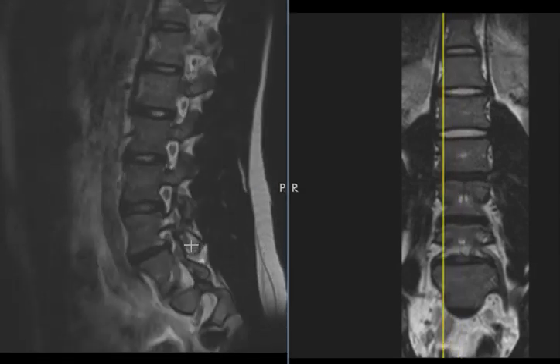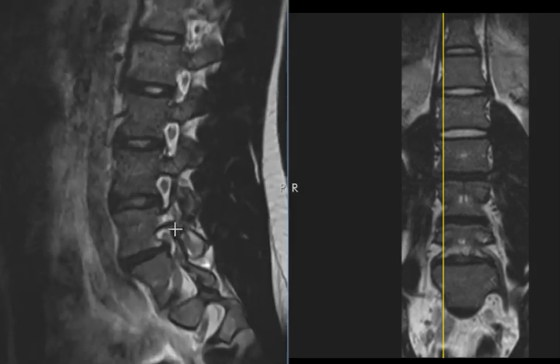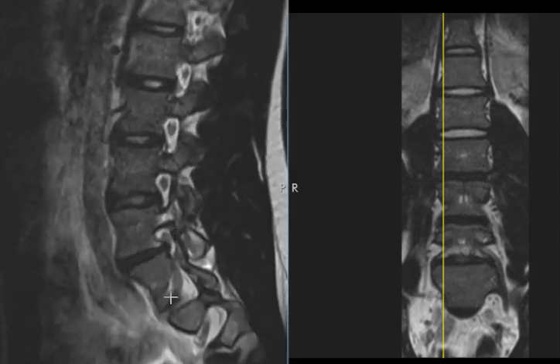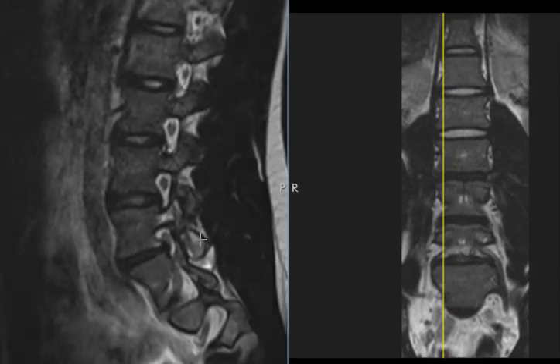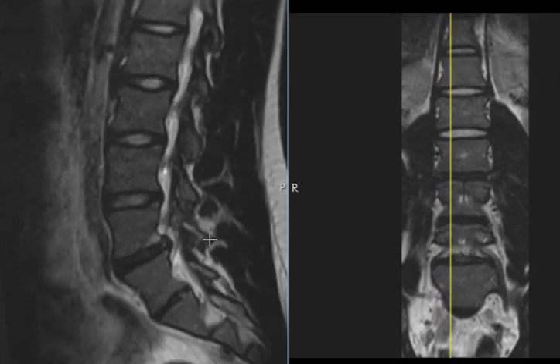If we roll off to the right, we see the foramen, which is a hole, and you can see the nerve going through that foramen. So again, this is a foramen, that's a nerve, this is a nerve, this hole is the foramen. We see something on this that is abnormal. In addition to having that disc herniation here centrally, the patient also has some bright signal right here and right here. So this is the part that connects the front to the back.